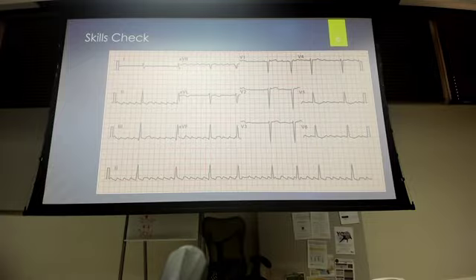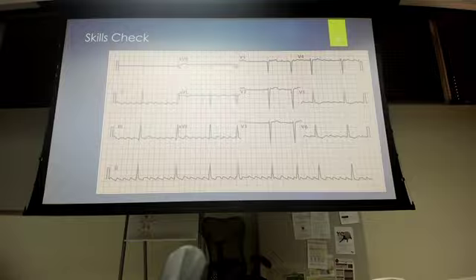Ross? Okay, ma'am, what do you think about this? What do you think's going on here? And I would encourage you to look in the same leads, V1, 2, 3, AVF, and see what we have going on. If we look at this ventricular rate, doesn't seem to be fast, but if we look at the atrial rate, it does. So what is that appearance of, you think?